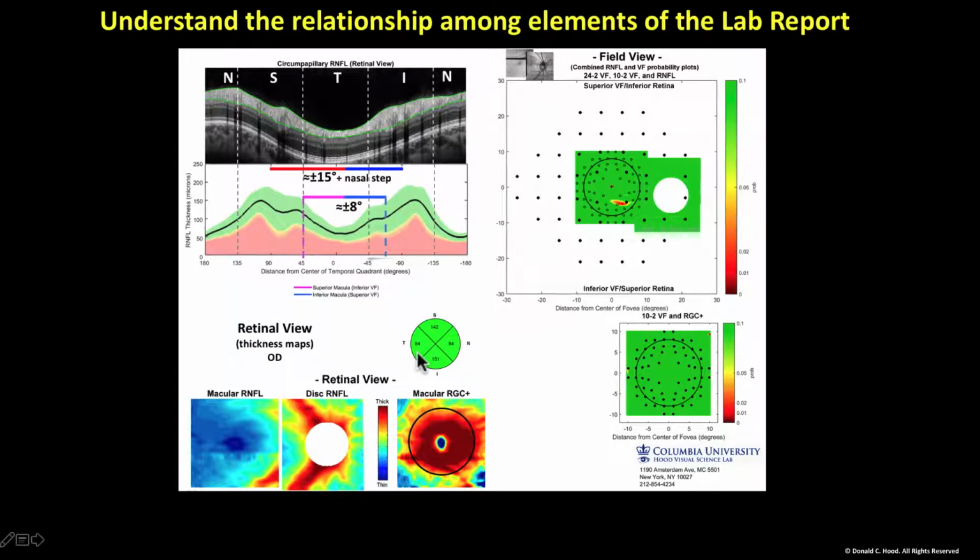displays should topographically agree. So I'm going to take this healthy eye, and I'm going to assume we give it glaucoma. So let's suppose that instead of being in the normal range, it dips down here, and then we'd expect to see something on the disc on the circle scan here. So let's assume that this is thinned, right? So we got real retinal nerve fiber layer damage there.